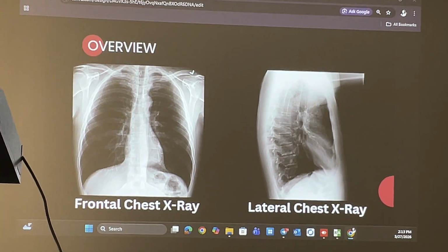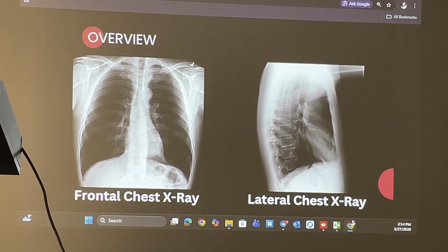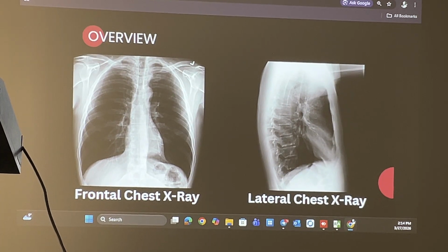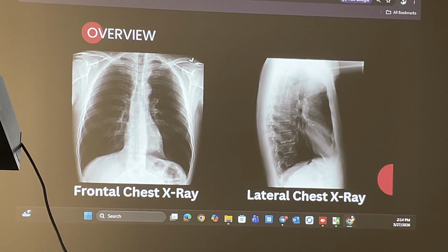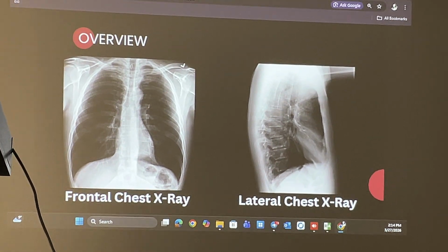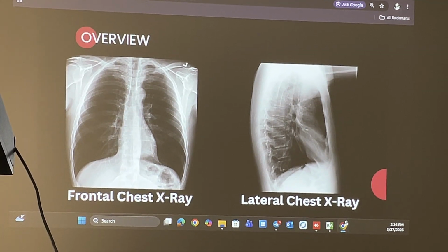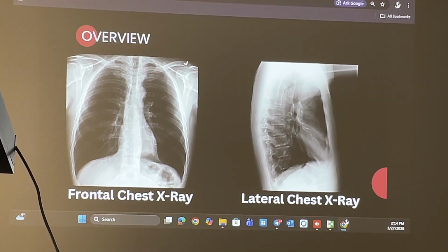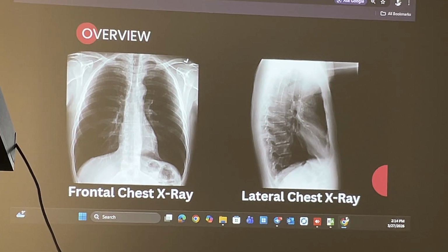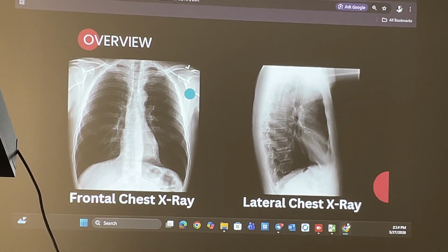Also on anterior posterior images there is much more of a shadow of the scapula superimposing the lung fields. As on the posterior anterior images, the patient stands with the heart hugging the detector, and the scapulae are moved laterally, freeing the lung fields. And lastly, there is almost always a marking of whether the image is anterior posterior or posterior anterior on the images.